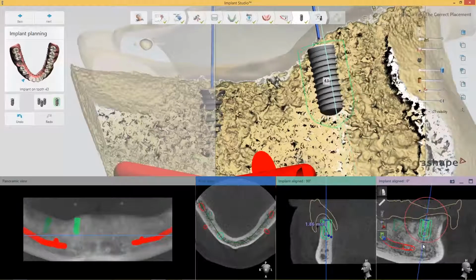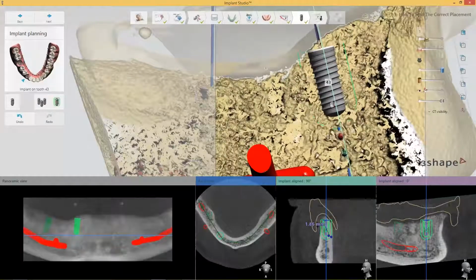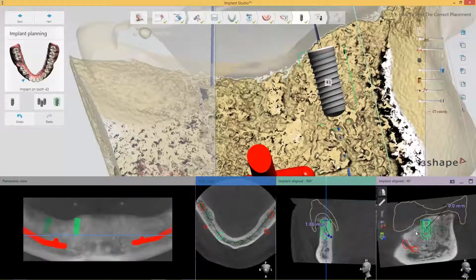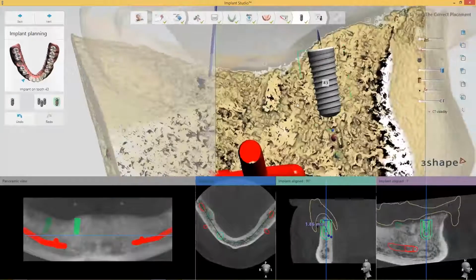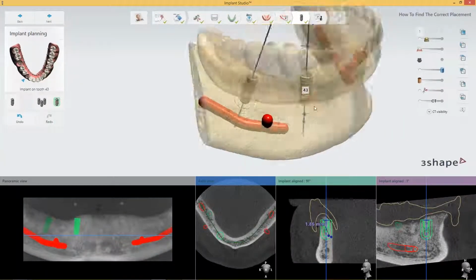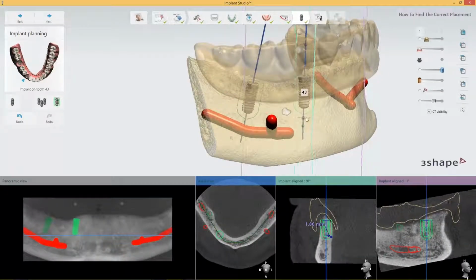And again, you're controlling it down in the 2D view just to make sure that you know your planes and how things are rotating, but you immediately see it in 3D, so with some practice you can work in 2D and 3D at the same time, and that's really where it becomes powerful. So this is just where I place it to see, but I check it up here, so I can see immediately how it looks. And if I now turn this off and make it semi-transparent, I can see how they are placed. And if I like, I can go ahead here and work with it as well.